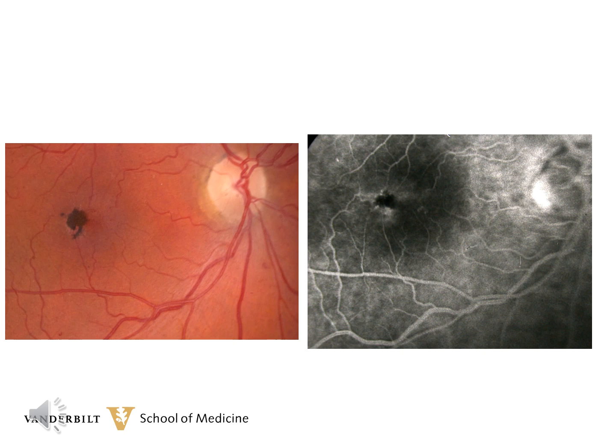Macular telangiectasia should be the first diagnosis you consider if you see this superficial black pigment temporal to the fovea. And you can see blockage on the fluorescein angiogram and some subtle hyperfluorescence at the lower edge and the temporal edge secondary to the telangiectatic vessels.